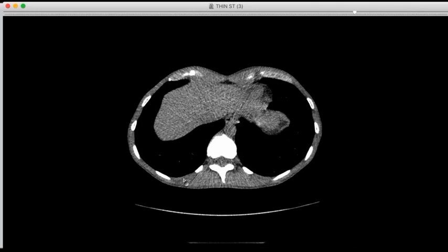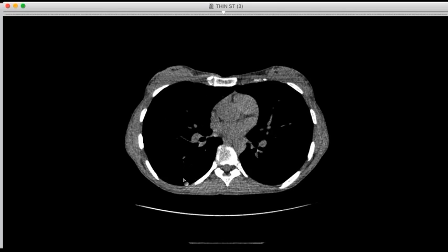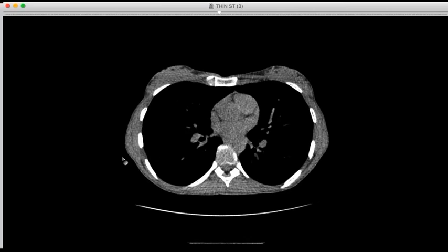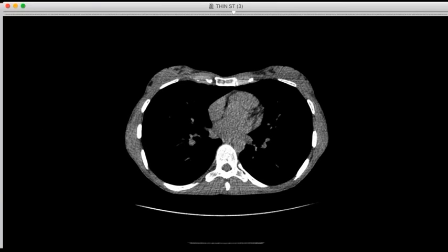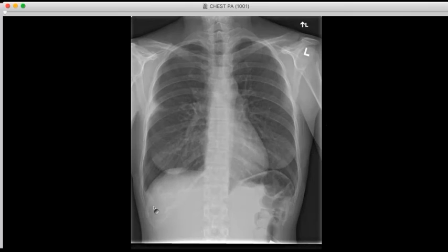But this was proven by urinary antigens, which is kind of how we prove this. So this is just sort of acute histoplasmosis, and whether that infarct was related or not, because we never could find a pulmonary embolism, is unclear to me. But it's unusual to get a pleural effusion with histo, so I suspect that was related to the infarct, the one we saw in the radiograph, that little bitty effusion there.